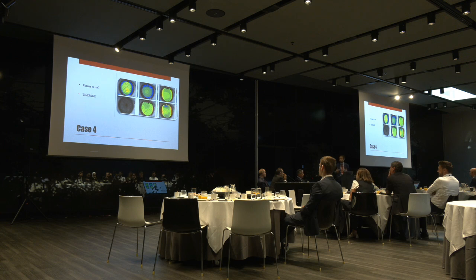So it's a patient that was using a lot of contact lens, inferior thickening, and so this is really making a difference. And also what you see is that you have a thickening in the epithelium where the posterior elevation is depressed, because it's not in the same place. If you look here, the thickening is here and the depression is here. So it's what is called red on blue.